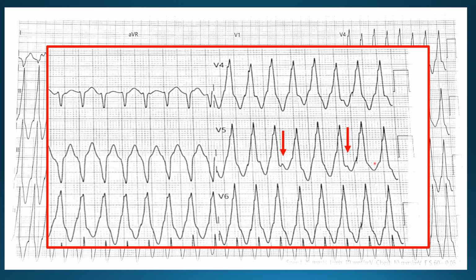Whenever we can find this feature in the ECG, then this is almost always a ventricular tachycardia. Although it is a difficult finding to look for and diagnose, it almost helps you in ruling out a supraventricular tachycardia. This finding is unfortunately seen in only 5 to 10% of the cases when we see them in clinical practice. So don't miss this VA dissociation.